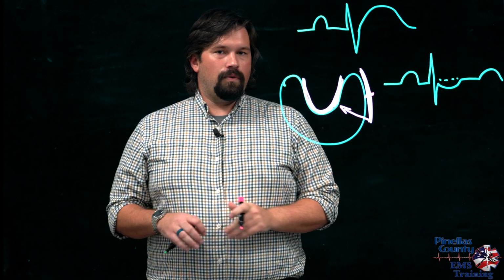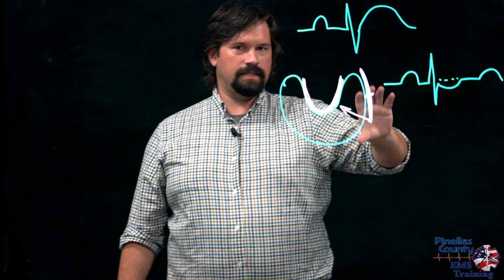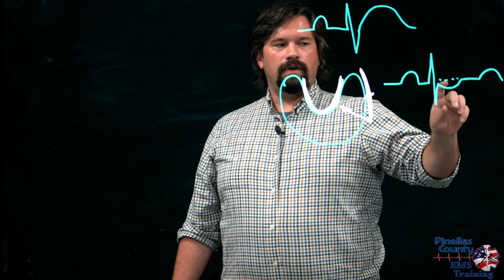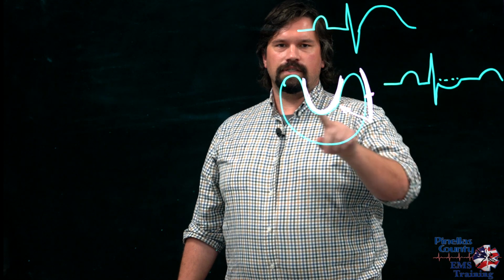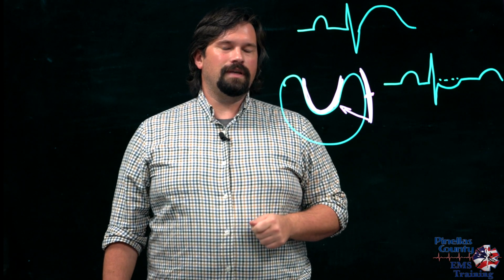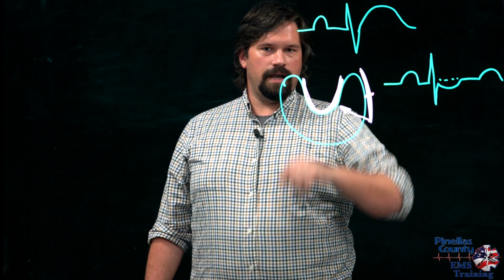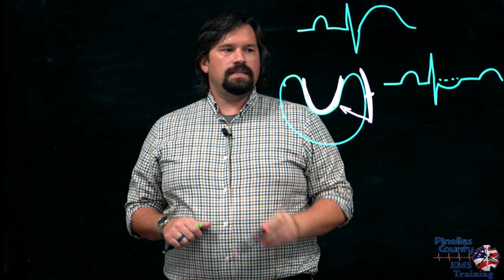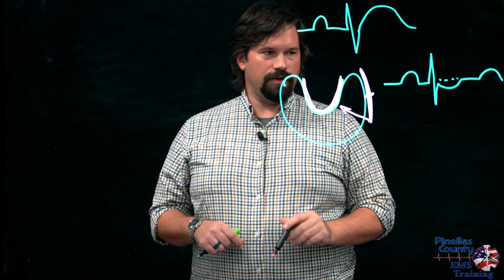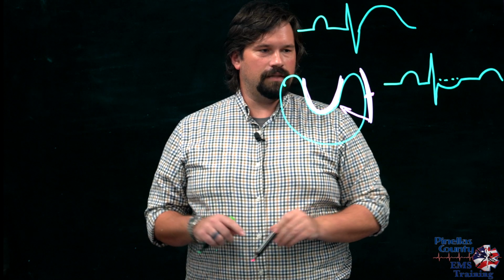Now the reason this is very important is because if you've had a major heart attack up here and the whole heart muscle is dead, there's not a lot we can do about that. However, if you're having these ST changes and it's just a partial blockage, this is the time where we really want to intervene. This is the time where we can do a heart cath to reopen this and salvage all of this big heart muscle right here. So when you've got somebody with chest pain with an ST depression, I would argue that you probably need to be a little bit more concerned than anything else. However, obviously a STEMI is very, very dangerous. Want to get those taken care of as well.